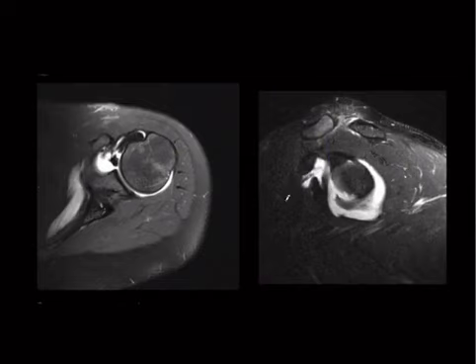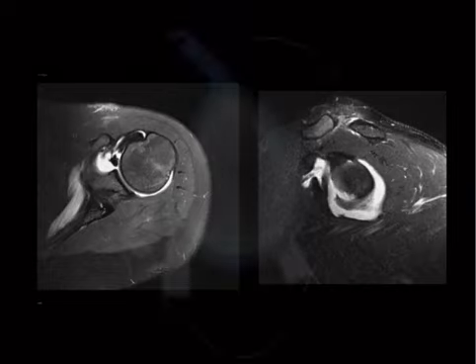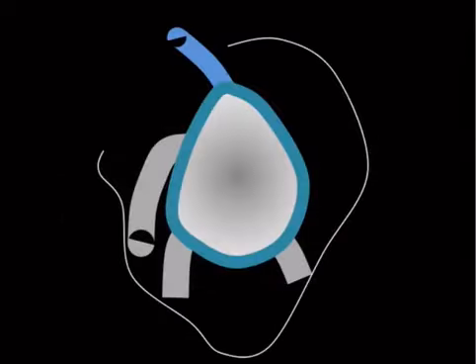ways here, and I will tell you that there is a thickened middle glenohumeral ligament, and there is absence of the anterior superior labrum. Should be like a triangle looking thing here, and there's not. And then we got this big fat thing here. This is a so-called Buford complex.